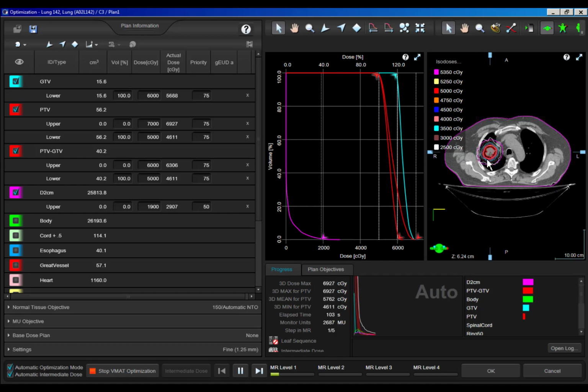But everything's looking good. So far our dose is shaping out how we want. You can see we have excellent coverage. Our GTV is up there. If you see our PTV minus GTV max dose is somewhere around, well, we can look here. It's 63.41, but our PTV max dose is 69. That means our hotspot is inside of our GTV, right? It has to be, which is good, which is what we want.